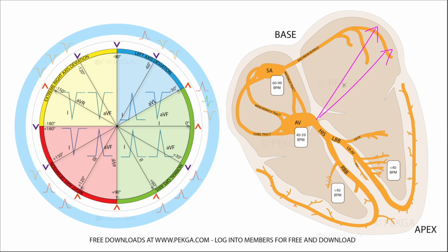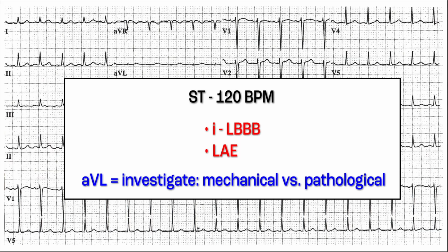But we don't have that segment. We don't have that segment. It would have been beautiful to see what AVL tells us about the P wave, or the progression of the depolarization to the left atrium, but we don't have that. If you were to fix that, you could probably confirm 100% that indeed you do have left atrial enlargement. However, we don't have that.